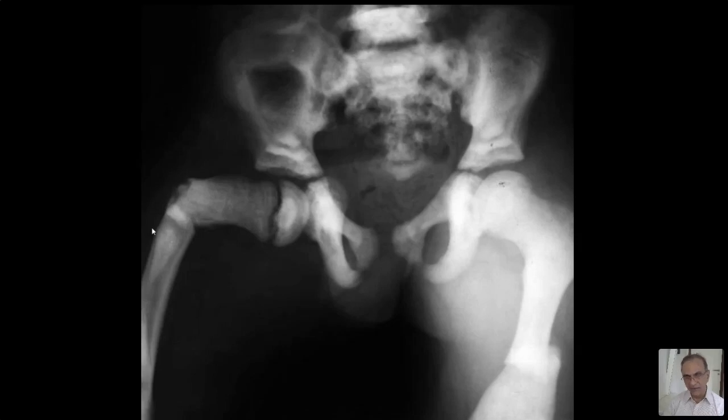They will break transversely. So when you see this type of fractures, that means the bone breaks horizontally. This is in fact called banana fractures. It's always pathological, always, every single time, unless somebody has taken a sharp instrument and broken it, right? That's an unusual variety of trauma. So this is banana fracture, whether the bone density is normal or abnormal, more or less. If you see a horizontal fracture, it's a pathological fracture.